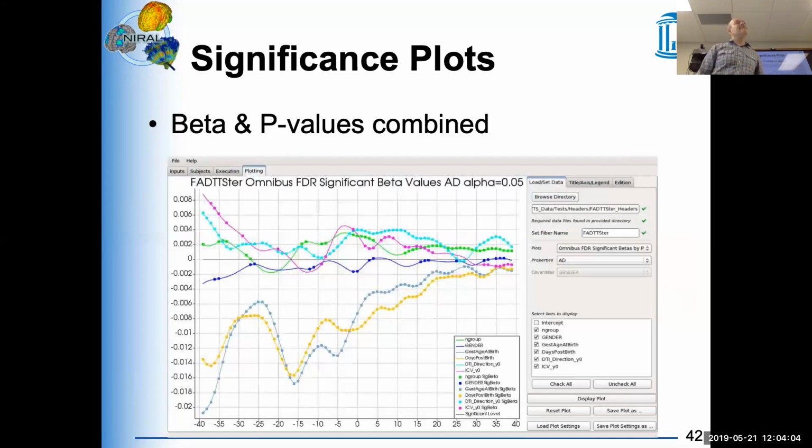So when you say each fiber needs to be in its own separate directory, you mean that there needs to be a directory of the actual... It means the output folder specified in the first tab, where you're saying where all the output goes for DTIAtlasFiberAnalyzer. That has to be a separate folder. Okay.